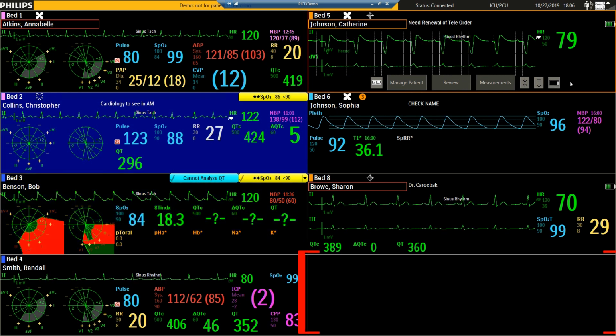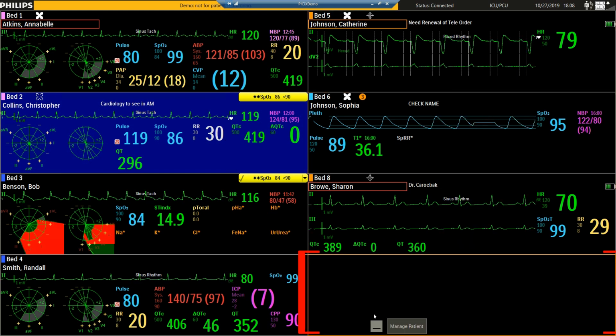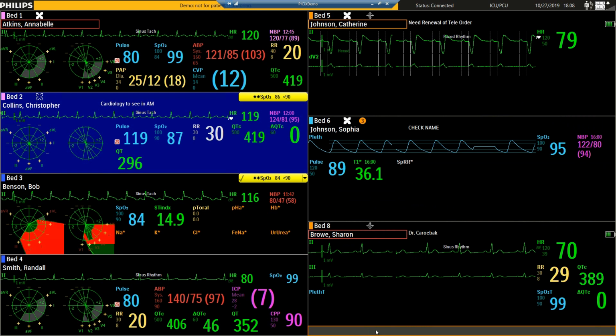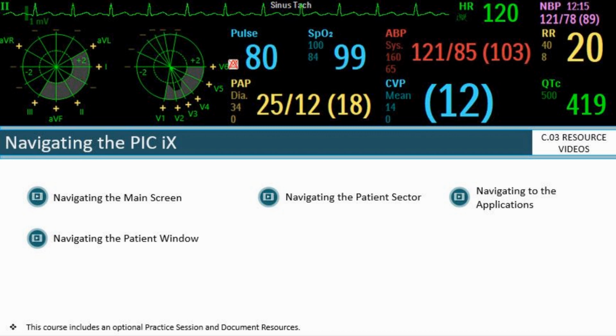And if you're not actively monitoring a patient in one of the individual sectors, you can minimize it until a patient is admitted. Throughout this curriculum, there'll be other videos that explain some of these things in more detail.